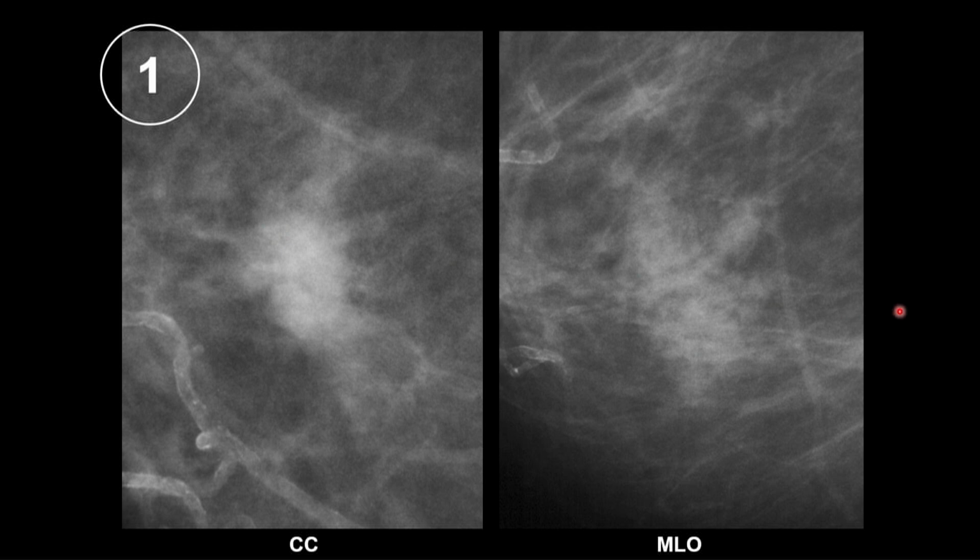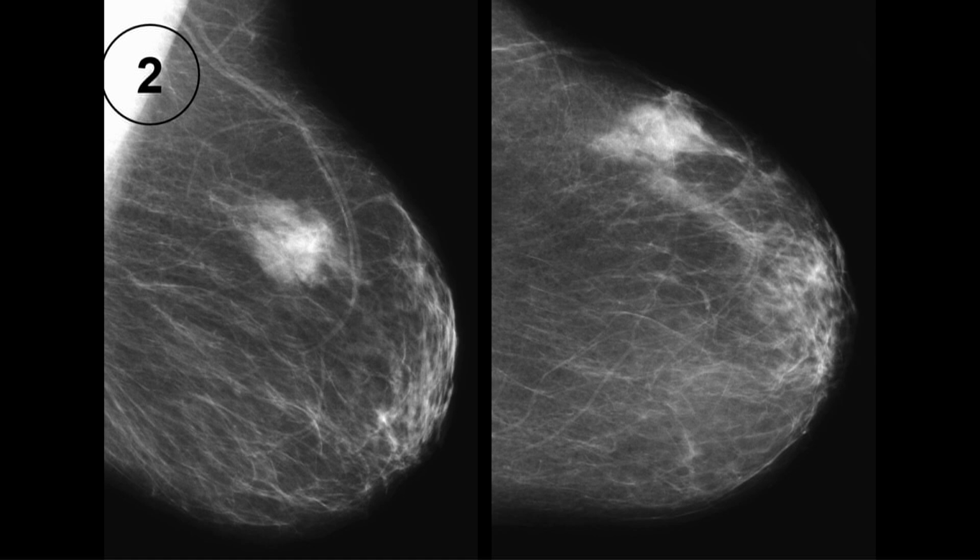So I didn't recall it, and I was right, but this is the extreme, and I don't expect you to do it. I'm just showing you an example of how the two-step process even works when you don't think it would work. Okay, so the answer is you could get away with no recall, but you wouldn't. All right, here's another one.